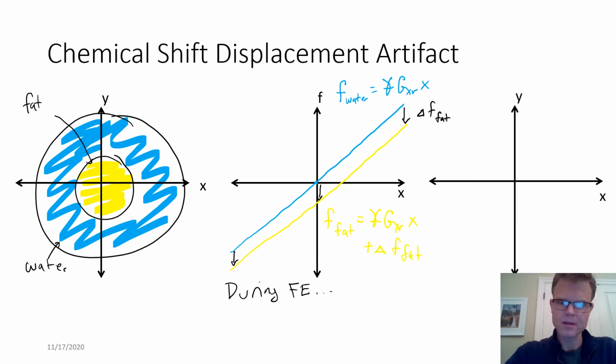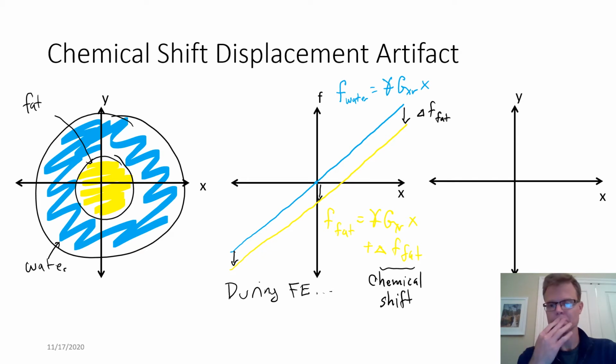This is what we would call the chemical shift. There's some frequency offset from water, and that's going to get mixed up into our image.